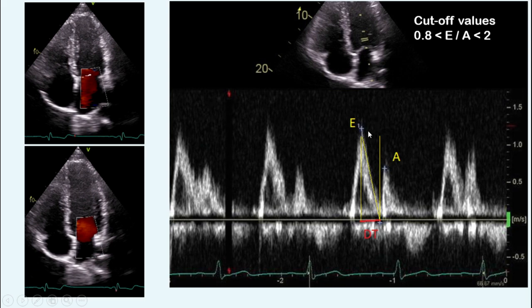For example, when we are dealing with a very young and athletic patient, an E to A ratio of 0.8 or 0.9 even is in the normal range, but we have to think that a young and athletic person should have a very elastic and soft left ventricle, and expanding shouldn't be a problem that causes this low E to A. So we have to put more attention on other details and make sure the patient doesn't have any problem.